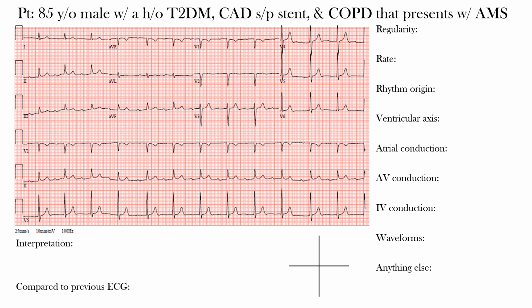Before we get started, let's review the approach we've been using to interpret EKGs. So notice that we have the patient's clinical presentation and then the EKG below. On the right side of the screen, you'll find a list of different parts of the EKG that we'll go through before making our final interpretation.